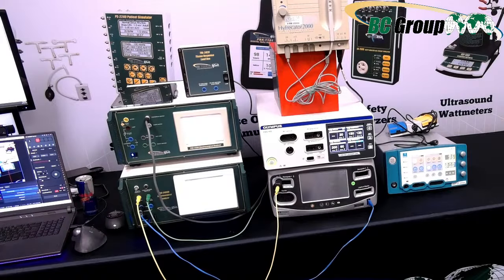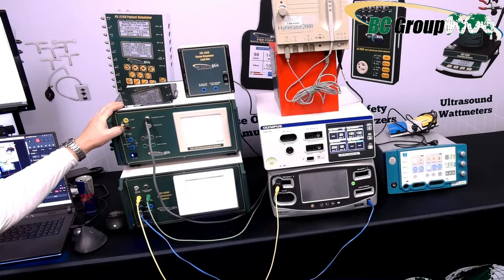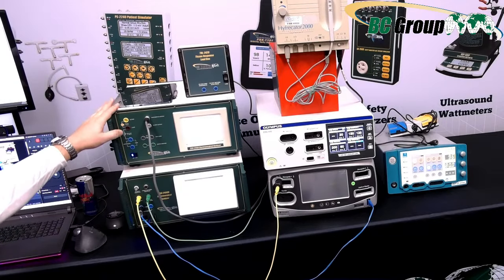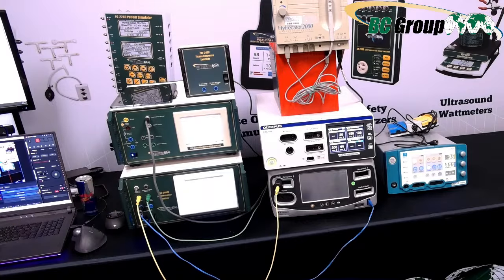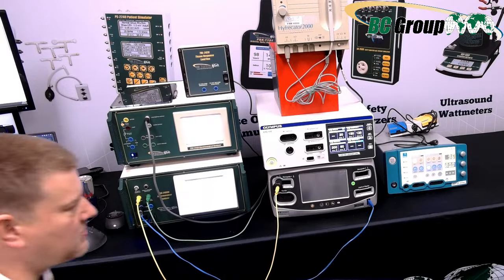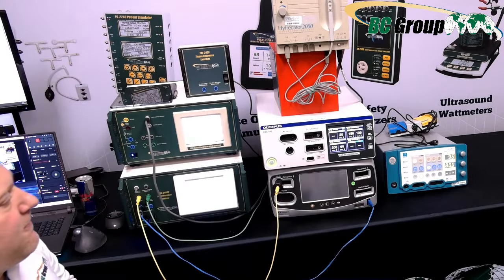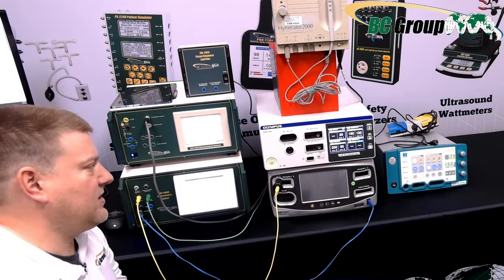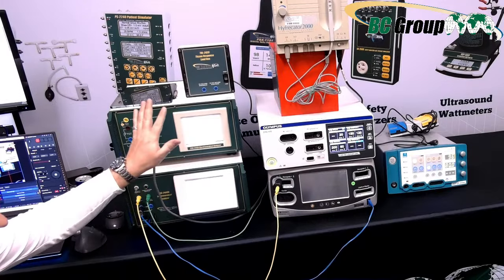All right, guys. So this is what we're looking at over here. I have the ESU-2350 Electrosurgical Analyzer, and I have the ESU-2400H. That's the H model, which does actually stand for high frequency. That is because some of the newer units, this guy and this guy over here, they are high frequency electrosurgical units. And that means that they are hitting up in the megahertz realm, which gives a lot of problems to older electrosurgical analyzers, okay?